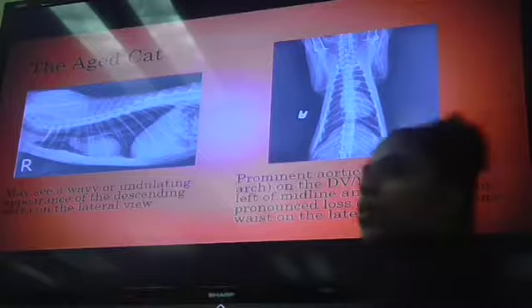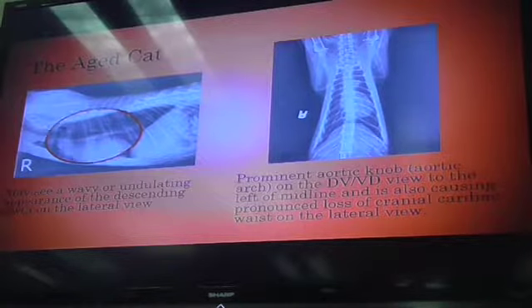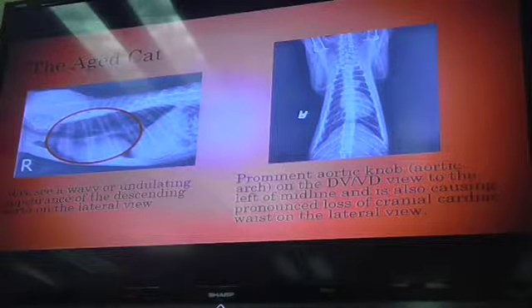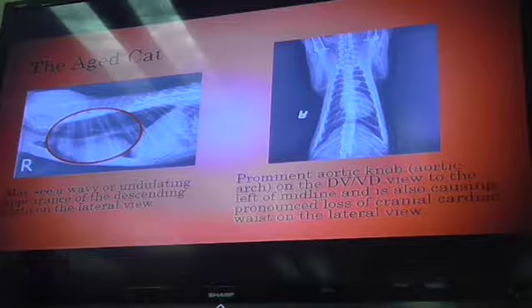All right, so you may see what we call a wavy or undulating, meaning it's just another word for wavy, kind of going around there. And look, I got some animations. Where'd it go? Oh, there it goes. Oh, this sucks. It was so smooth and pretty. So I learned how to do this one time, and it took me forever to figure it out, but I figured it out. So this is zooming in on this area of the aortic arch.